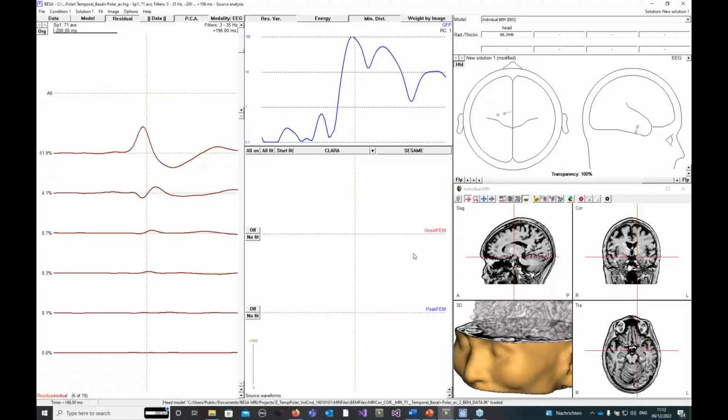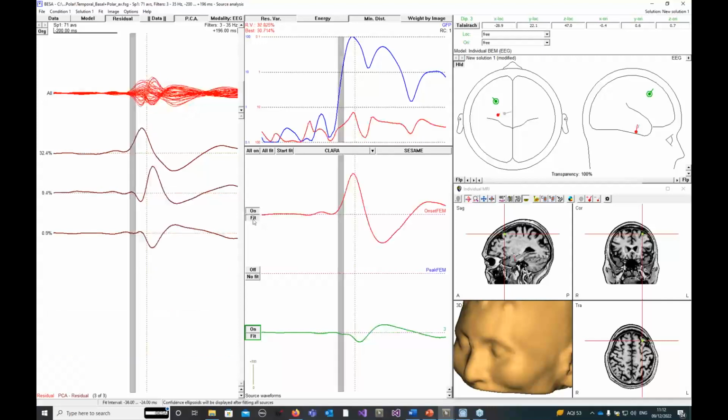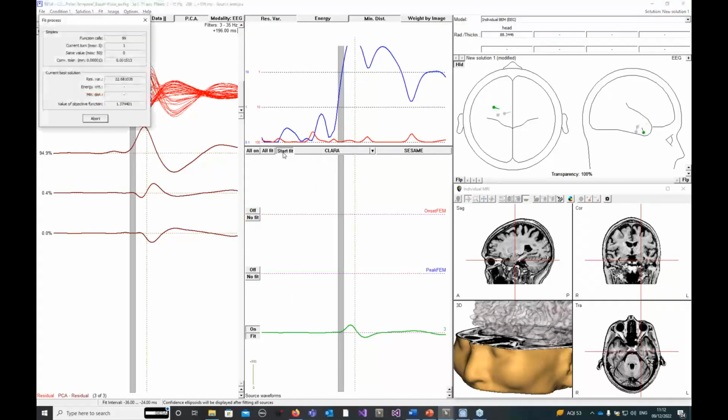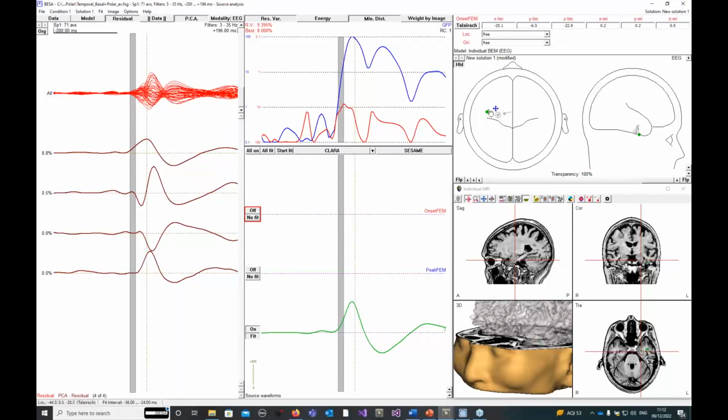Okay, this is going to have a slight adjustment of source positions because the boundary element model has a slightly different source space available. So the source is maybe moved by a millimeter or so, but it'll still be more or less the same. And now I want to add another source and model this one for the onset interval. In fact, I can use the same interval that I've remembered here and start the fit for the BEM model. Yeah, so we can see the boundary element model is the same depth, but it's more lateralized compared to the finite element model.